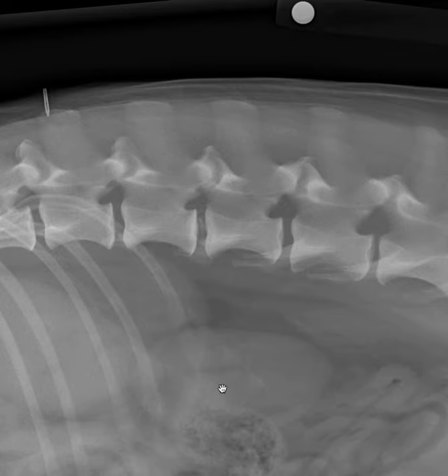When I think about my subroutine, one of the first things that I look at is the intervertebral disc space width. I would argue that this disc space width, so the kind of cranial to caudal width of it, is reduced compared to the vertebrae in front and the vertebrae caudal. The best comparison for spine is always going to be the adjacent vertebrae. In addition, when I look at this disc, it has increased opacity. This is the appearance of partially mineralized intervertebral disc.